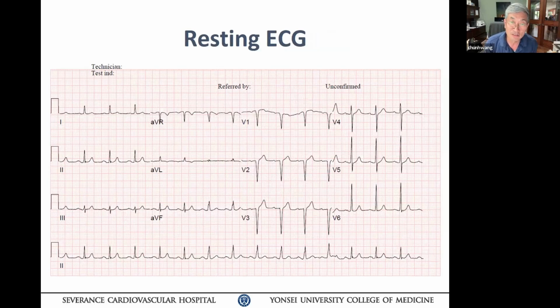So do the fine, and then this baseline. The patient has almost a first degree AV block, but not quite there yet. The ECG is about the same, except a little different in V4, V5. Okay, keep going.